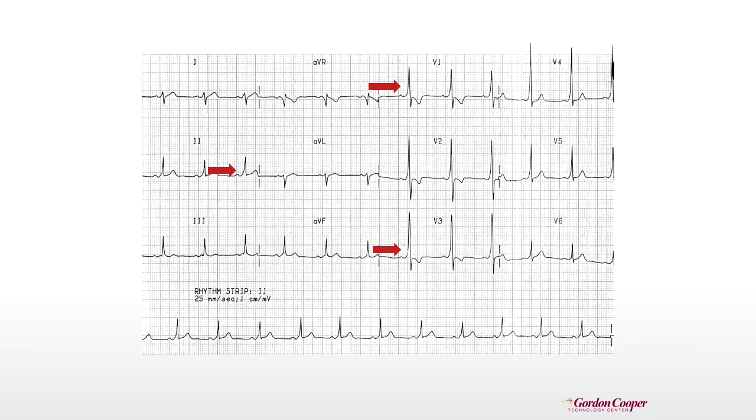So here's a good example of it as well. We see it with the little red arrows, obviously. But that's another good example.